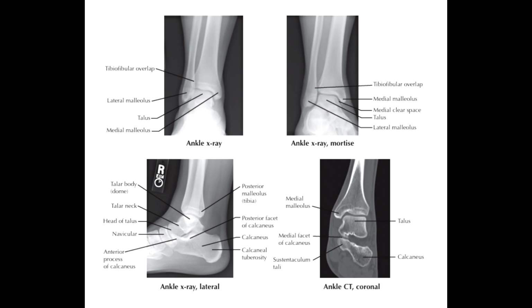It is time to integrate this knowledge with radiologic imaging. Radiographs and CT scans are not just complementary tools. They are absolutely essential in the evaluation of injuries, deformities, and degenerative processes of the ankle and foot. In this part of our lecture, we will walk step by step through the standard imaging views, discuss what each one reveals, and emphasize their clinical applications.